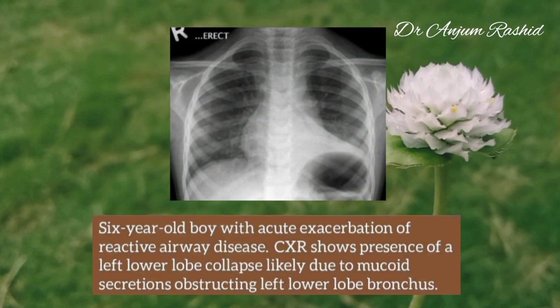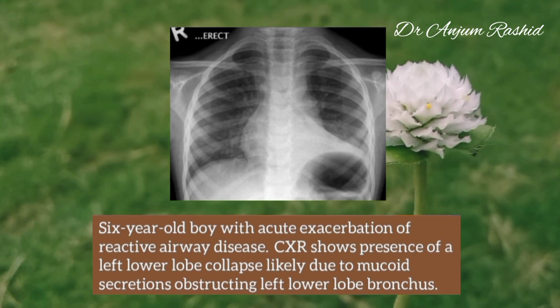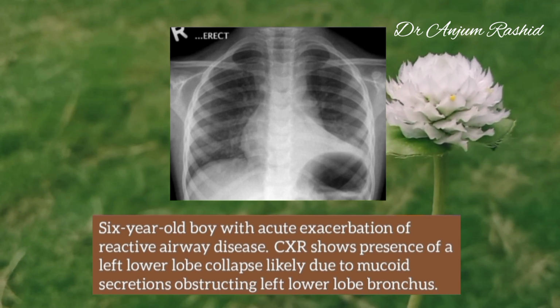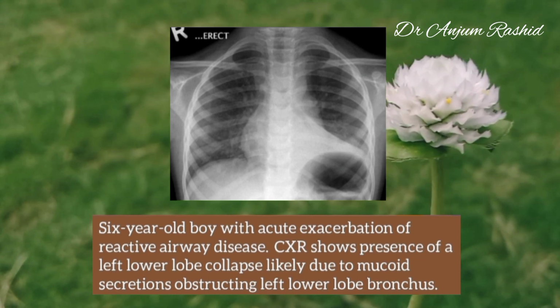6-year-old boy with acute exacerbation of the reactive airway disease. Chest X-ray shows presence of left lower lobe collapse, likely due to mucoid secretion obstructing the left lower lobe bronchus.